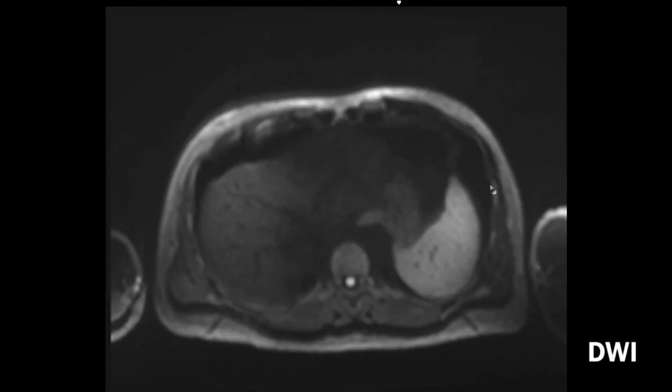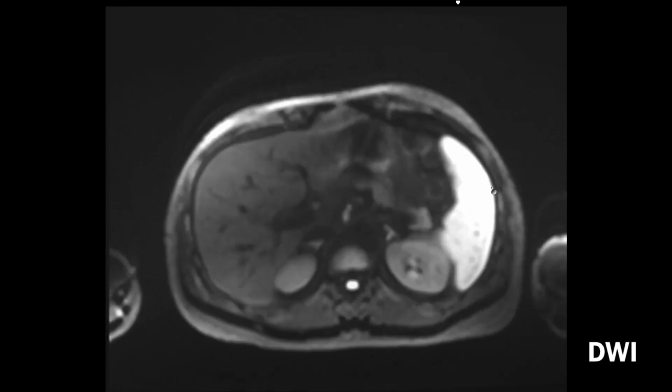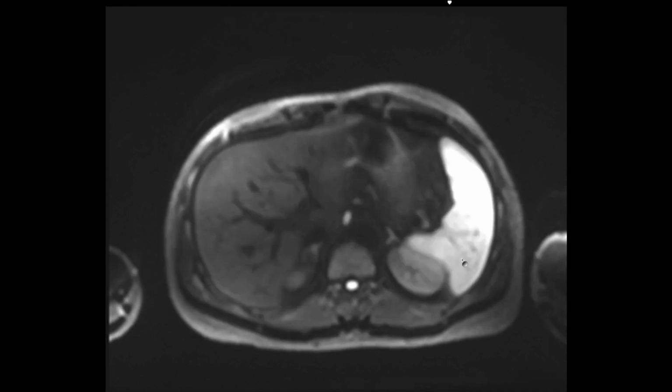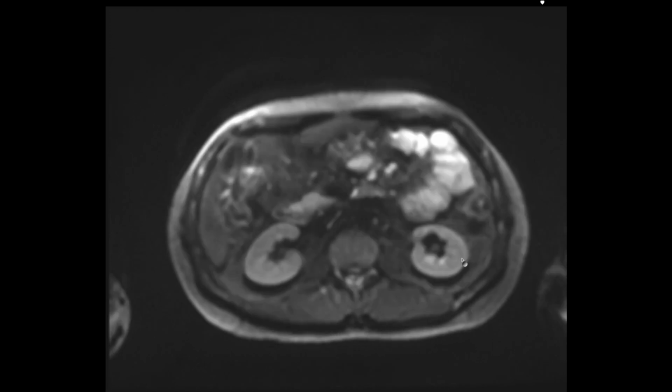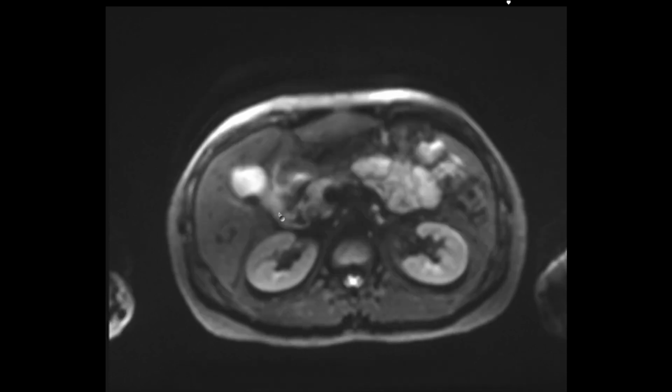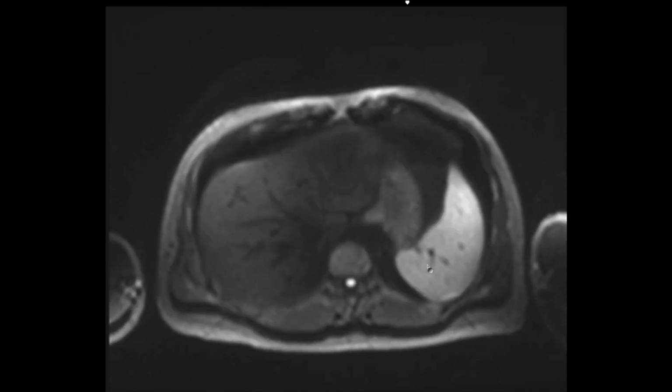Lastly, we have our diffusion weighted images. So you'll notice right off the bat on these DWI images that the spleen is bright. We mentioned earlier that the normal spleen restricts. So the splenic tissue signal on diffusion weighted imaging is a good marker for what is diffusion restricting. And so on DWI images, this is bright here. You'll notice that there are other bright things that are not actually truly restricting, like the gallbladder. So this is that T2 shine-through effect that we talked about. So the spleen is truly restricting.